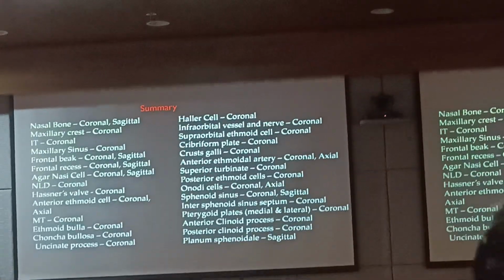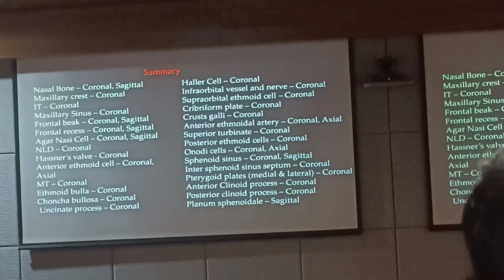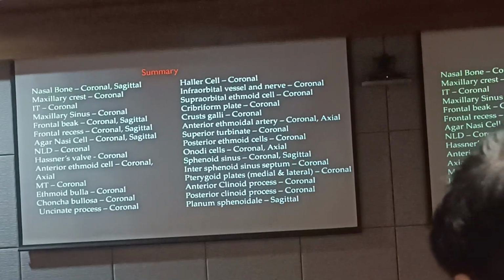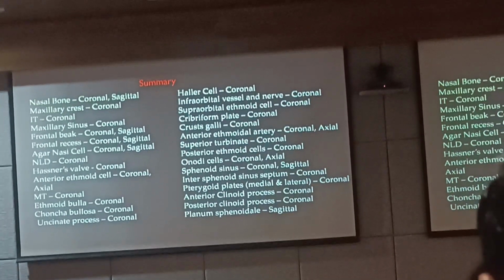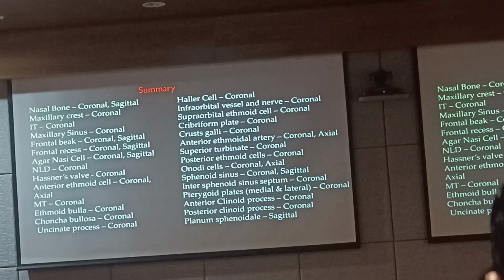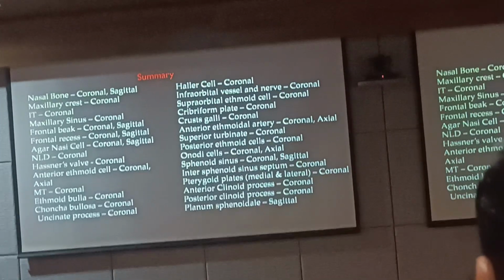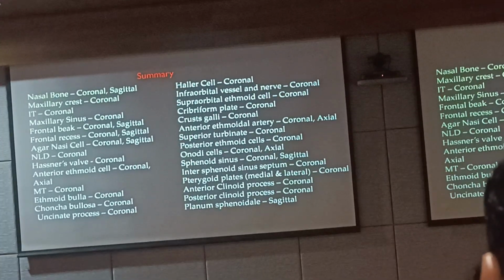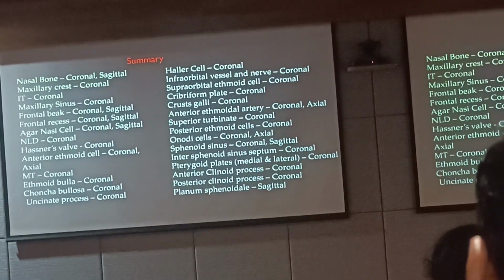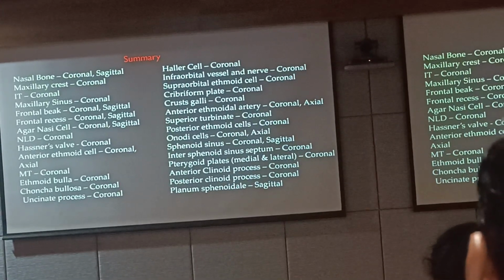So that's all about the frontal. Ethmoids, I already told you, be very careful, study the configuration of your skull base and go and clear out the ethmoidal cells. Uncinate, I already talked to you. Middle turbinate, I've told you, we don't do anything much to the middle turbinate. And maxillary sinus, I think everyone knows. Once you take off the uncinate, it's pretty easy to identify the maxillary ostia and widen it. And again, in the surgical aspects, we'll teach you the maximum limit you can widen the maxillary sinus ostia, or how you widen the sphenoid sinus ostia, and so on and so forth. I think that will all be in the surgical part. So everyone clear about the scans thus far?